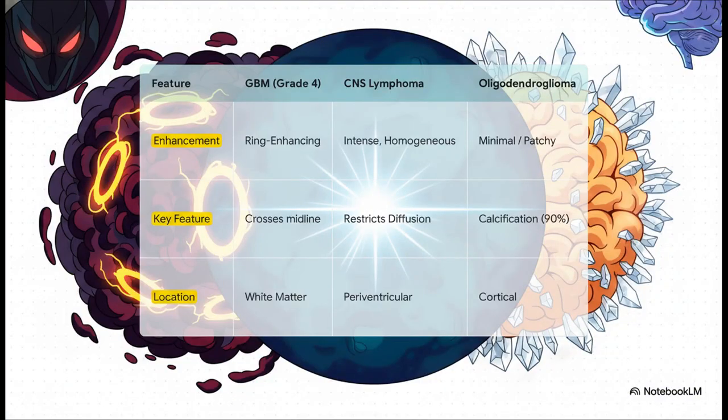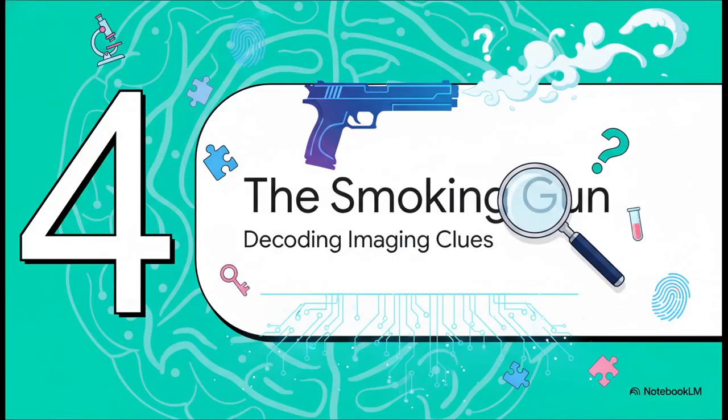And now for the three big aggressive adult gliomas. First up, the classic villain, glioblastoma, or GBM. It's a nasty, irregular, ring-enhancing mass that loves to spread across the midline. Next, primary CNS lymphoma. This one is usually a solid, intensely enhancing mass that really restricts diffusion. And finally, we've got the oligodendroglioma. Look for this one in the cortex, often with calcifications, and it has this weird tendency to look like it's expanding the brain's cortex.